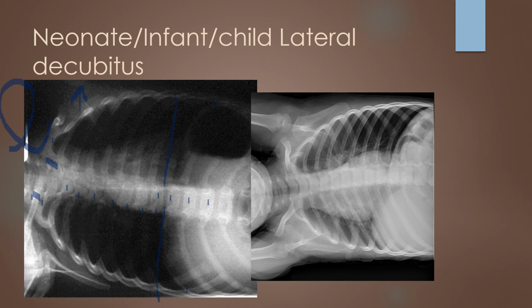The manubrium, from what I can tell, well, it's right in this region, so that would be 1, 2. So the manubrium is a little bit high. The patient does probably seem to be tilting back superiorly. So this is absolutely 100% a repeat. We need markers on here. We need to completely adjust the technique.